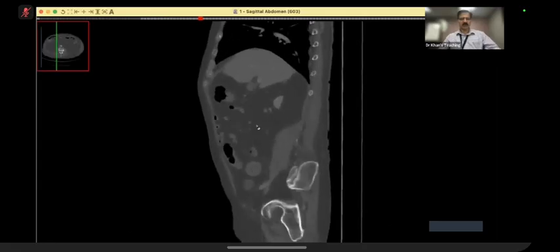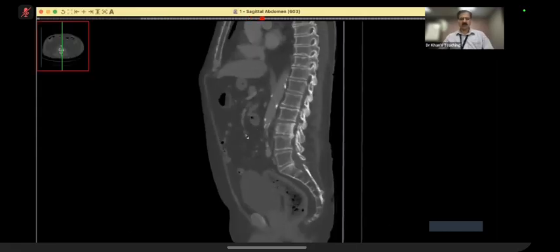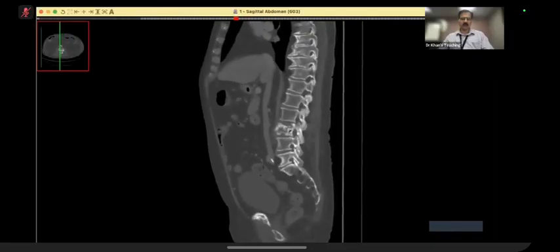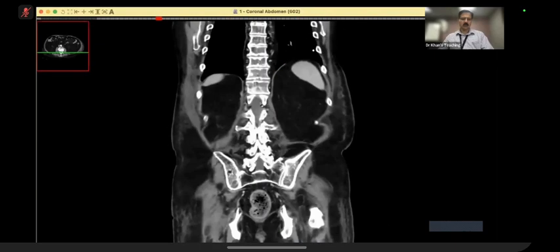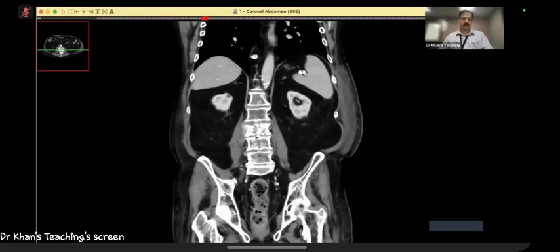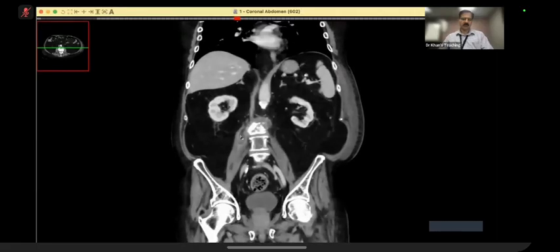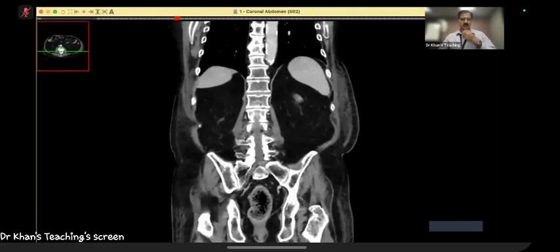So in the exam, if I want to give you a long case, I will just give you axial. Otherwise, if you've got the luxury to see everything, you can see these fracture lines. So this was the fracture. And of course, on a coronal also you will be able to see, here you are. You see this enhancement. This is the psoas abscess, and here it becomes even better, and the bubbles which I was showing you. So this was a satisfaction of search case.